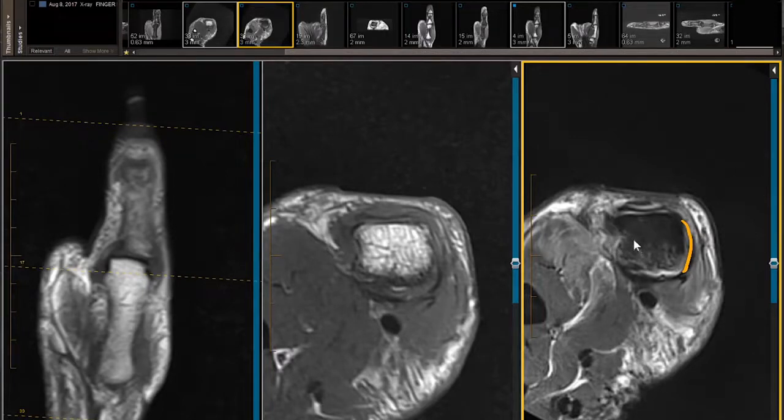And where is it? It's pointing dorsal and medial. I call this the dorsal-medial lollipop sign. Short axis view, here it is right there. There should be no structure there pointed along the edge of the metacarpal. That is a total clincher for the diagnosis of a Stener lesion.